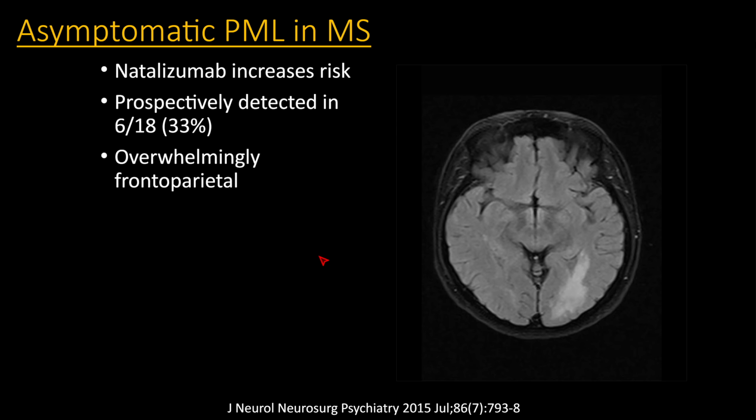So just to reiterate, this is a case of PML occurring in the setting of MS, and in particular natalizumab, increasing the risk. It's important to know that these people with MS get routine follow-ups, and it is not uncommon for them to have asymptomatic PMLs on a routine follow-up.